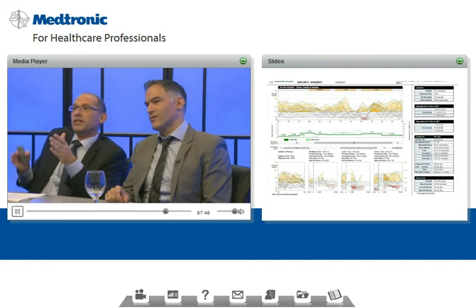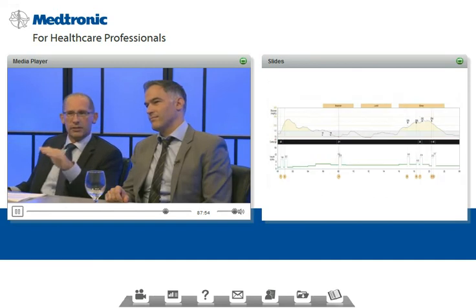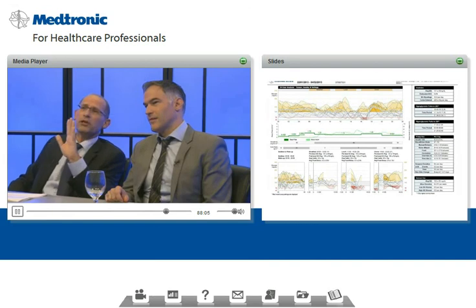If you look at the downloads in a systematic way, first fix the night time, because it's easy, it has fewer inputs throughout the day, and it's clear that she needs an improvement in the glycemic control. During the night, increase her basal. Will that solve the problem? Probably not, because we still have large excursions during lunchtime and dinner time. So how are we going to address this?